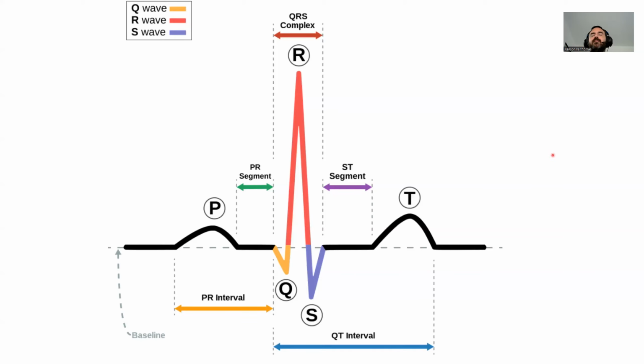I'm just going to give a little bit of a preview to that. Atrial fibrillation means the atria is fibrillating. It means that instead of giving nice big beats, it's kind of quivering, right? It's not doing a full nice big contraction. So oftentimes, what we're going to see on a rhythm strip as a result of that, and spoiler alert for when we go over atrial fibrillation, is going to be kind of like a zigzag. You're not going to see a nice P wave and then a QRS. You're going to see just this, right?